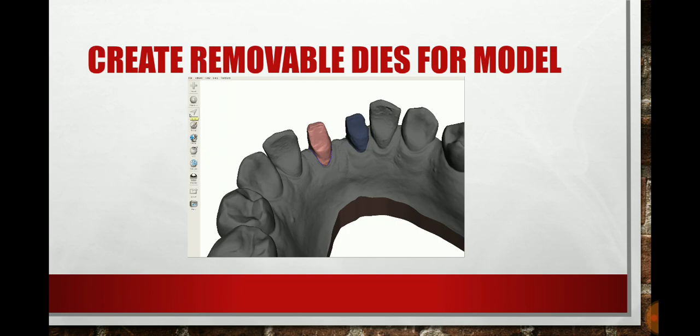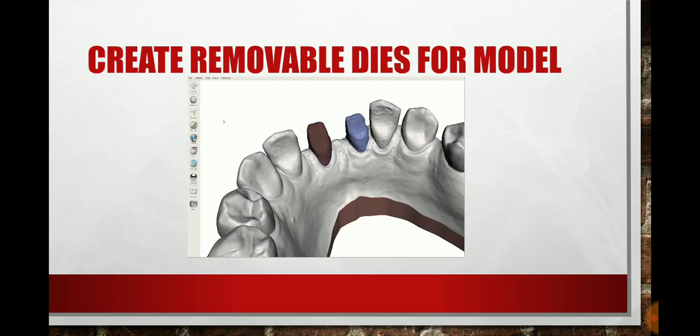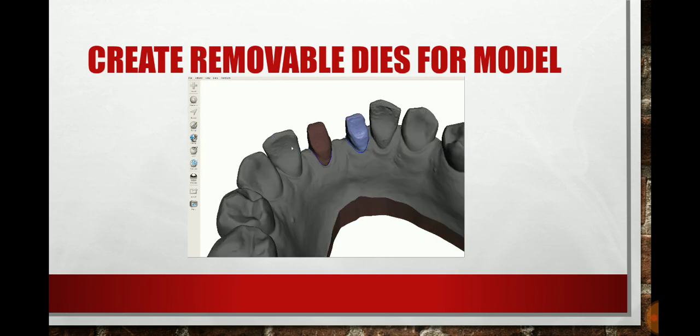So you want to do the same separation. You'll have to go back and click on it, and you'll see me kind of go around here because I need to click on it. You can't see off to the right just because I had to cut the screen, as I had some different information on that screen. But there you go. Then we're going to select that prep as well, and we can separate it.